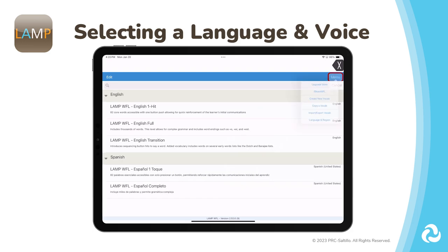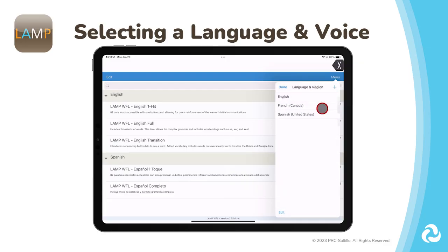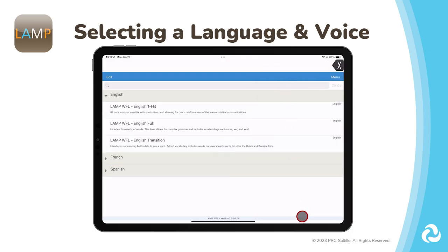You can add other languages to your list by going to Menu, then Language and Region. Select the plus sign and choose the language you want to add. Then select Done. That language will be added alphabetically to your vocabulary file list.